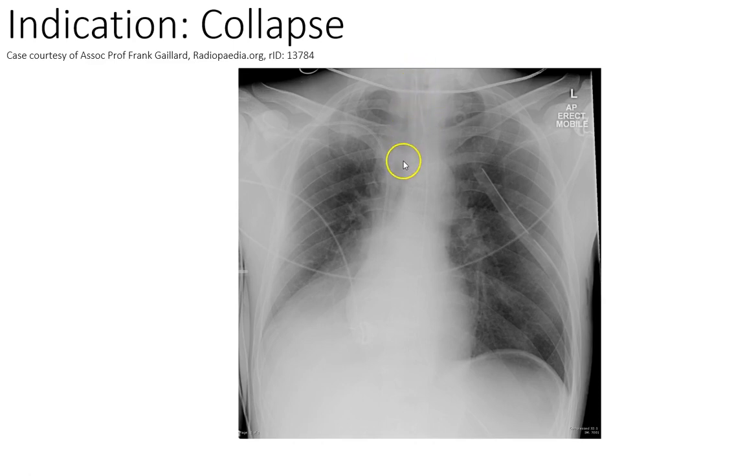The trachea is fairly, you can see that's the bifurcation to the two main bronchi. Sometimes it helps to look at things from a different angle, but that's the triangle of the two, and so it goes down to there and it's coming down here, and I'm not seeing anything particularly abnormal there. Looking at the rest of the lung markings, I'm just wondering if there's a little bit of a pneumothorax left up here. Lung markings, I can definitely see them to there, but then perhaps I lose them, so there might be a small pneumothorax up the top.